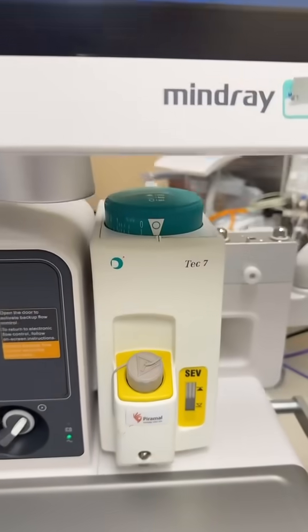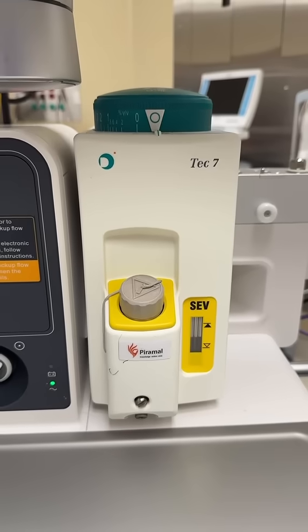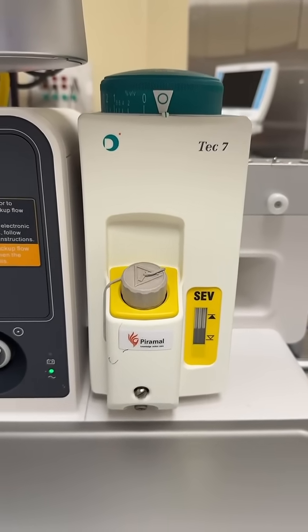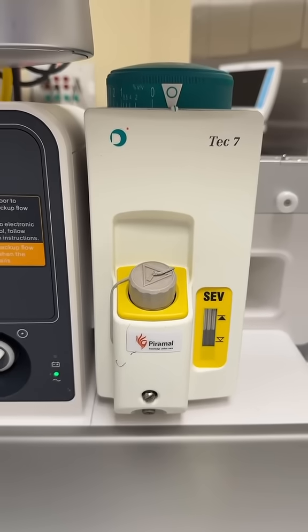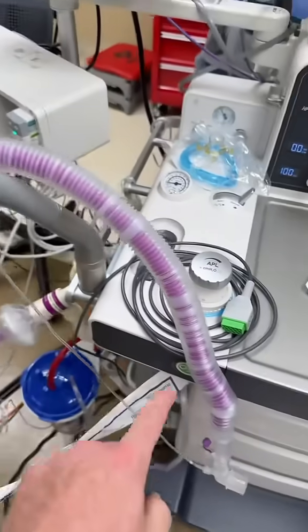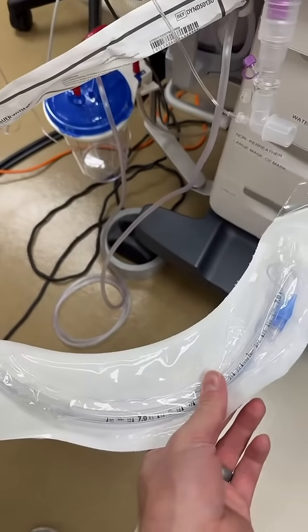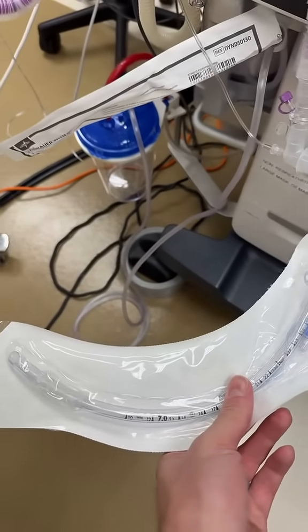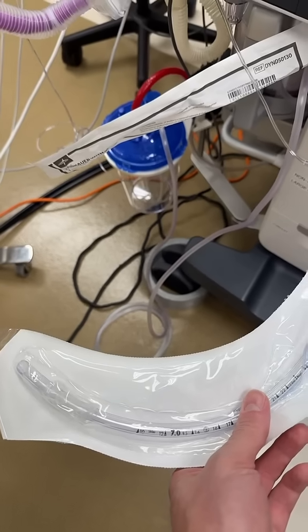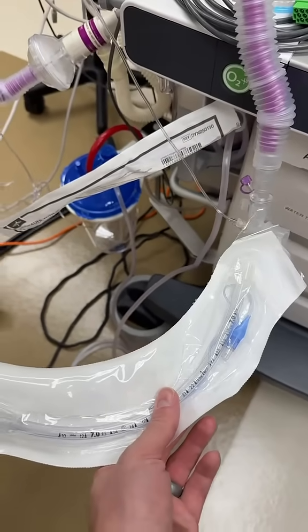Down here, this is called the vaporizer. This is probably the heart of the anesthesia machine because it contains the liquid that will keep you under general anesthesia during surgery. The way it works is it gets heated inside this vaporizer from a liquid into a gas. It travels all the way out of this breathing circuit. This breathing circuit is connected to your breathing tube that is down in your trachea. That gas goes down your trachea to the bases of your lungs, where it's absorbed by your bloodstream, travels to your brain, and keeps you under general anesthesia. That's the way you stay asleep during surgery.